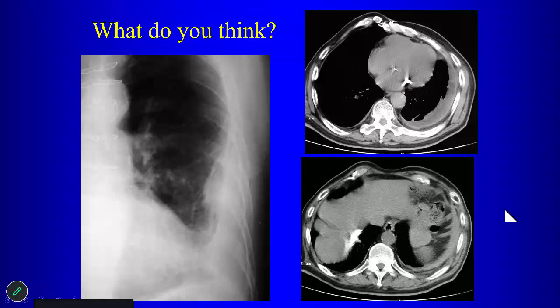This patient, what do we think is going on in this patient? What are the findings here? Well, the obvious finding is left pleural thickening and right pleural calcifications. There's left pleural thickening with pleural effusion, and on the right, that's not the IVC, it's a non-contrast CT. That's pleural calcification. So your diagnosis is mesothelioma, or asbestos-related pleural disease.